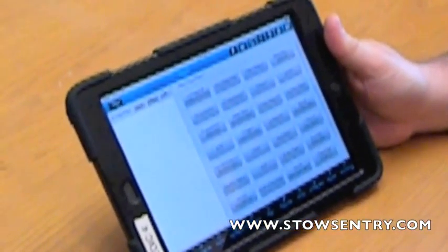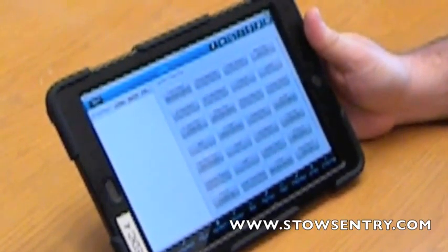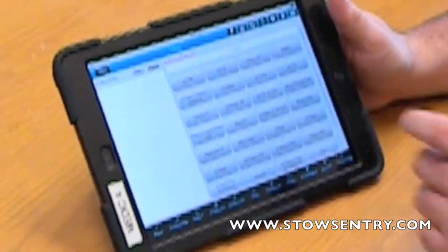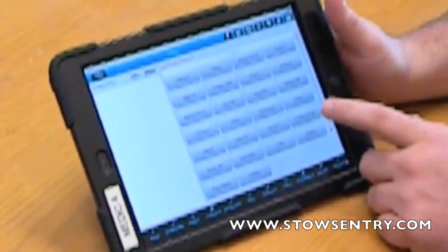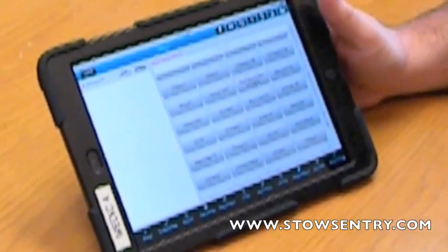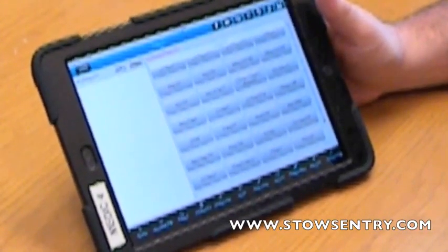The good thing about all this is we can transmit this to a hospital and it's replacing all of our paper reports that used to be required, and now we just have this to do. We have a list of patient medications here, a very long, extensive list of medications the patient may be on. And if we run across some that we still do not have in here, we can hit other and enter those as well, so we can pass those along to the hospital.